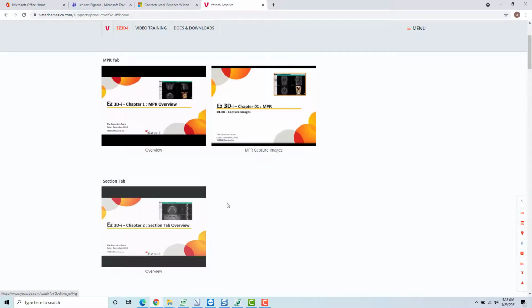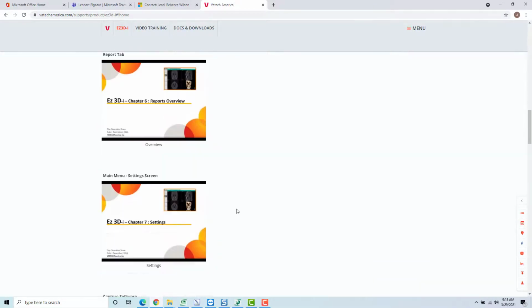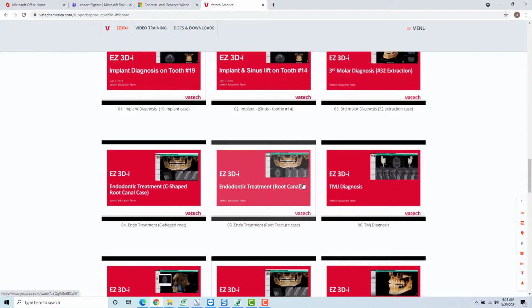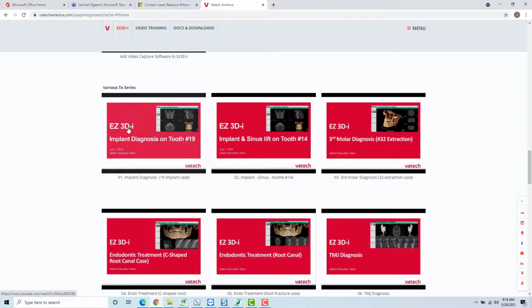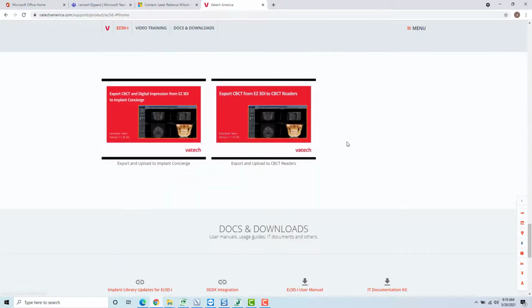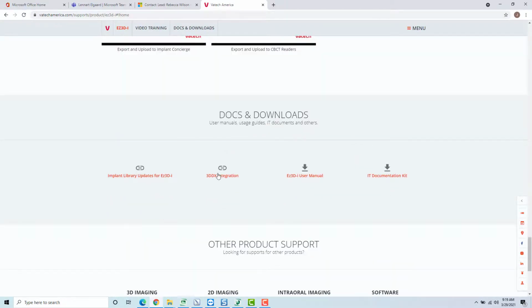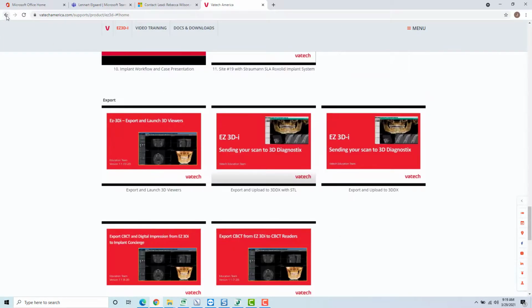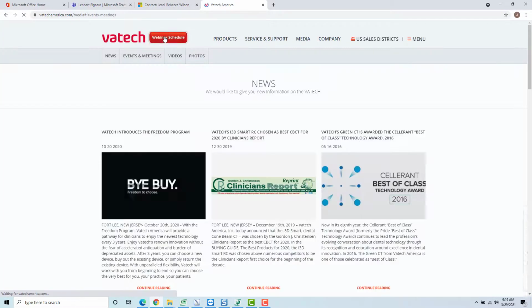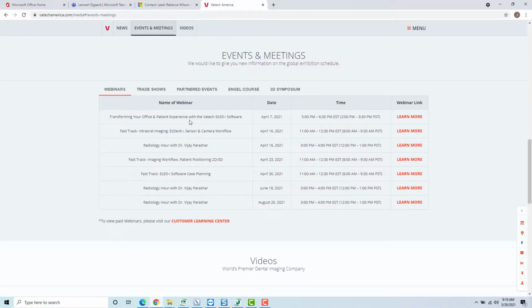What is the MPR tab, section tab, and I'm going to scroll down all the way through reporting, capture software, and we also have some individual treatment series through here. How to export, and then user downloads for your reference. Other options, we have our webinar schedule, which shows all of our upcoming webinars with some of our key opinion leaders with our education team.